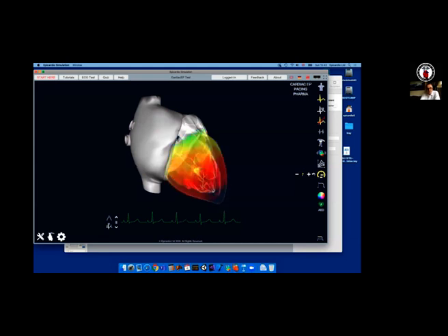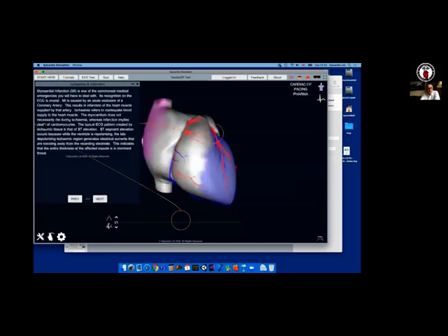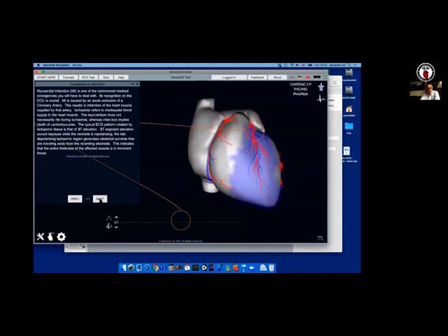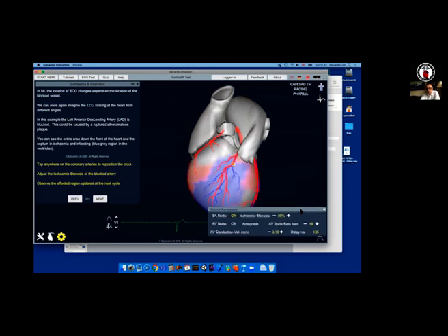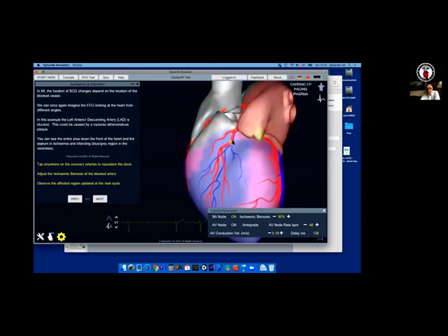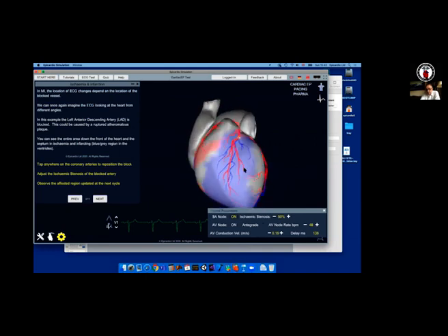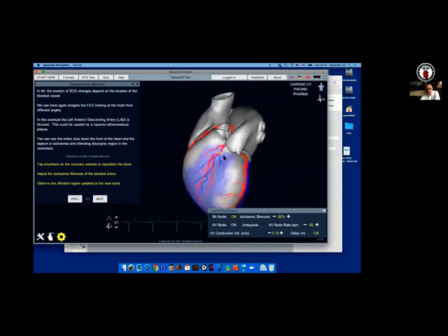Now, let's jump straight into ischemia. I will get into some details later, but since we were looking at the case study, we want to go straight into the ischemia and infarction section. And here, it will show us this case that we were looking at earlier on, where we have an occlusion. You see this yellow dot, zoom in, and you see a gray area, which represents the ischemic region in the myocardium. And here we see that there is an occlusion of the LAD, and we have something like 50% stenosis, you see here. And we see the ST elevation on the ECG.